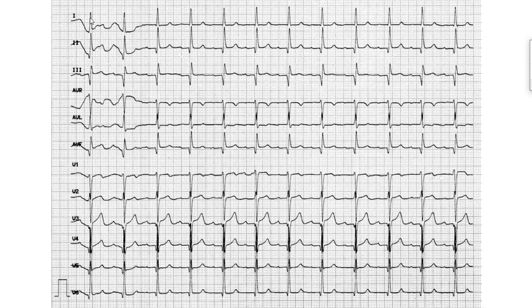We count these for the heart rate, of course. 1, 2, 3, 4, 5, 6, 7, 8, 9, 10, 11, 12. Because despite him getting onto the chair or whatever, his heart was still beating. Maybe they might not be representative, but they're still beats. So we count them for the heart rate calculation. So that's 12 beats, so 12 by 6 is about 72 beats per minute. Yeah. Point 3, 4, we describe the P waves, pretty small, but fine.